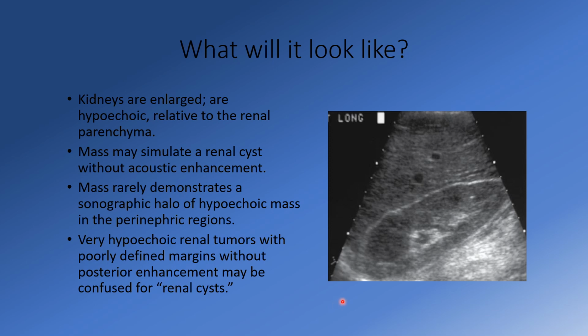In this case, our lymphoma is right here. It's isoechoic, slightly hypoechoic to the rest of the renal cortex. It does not look like a cyst in this case.